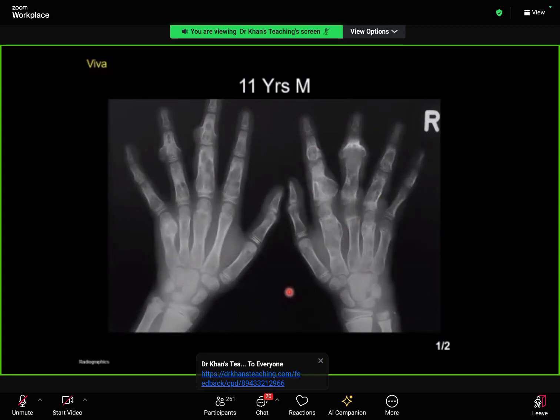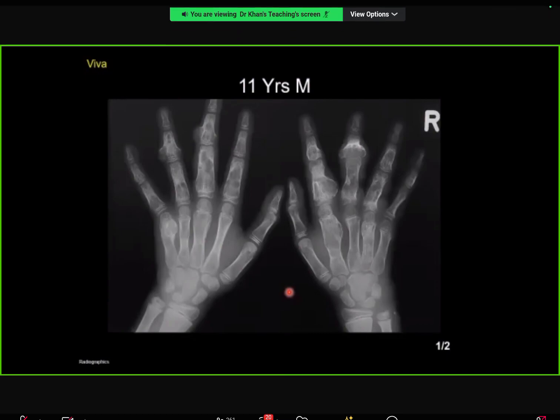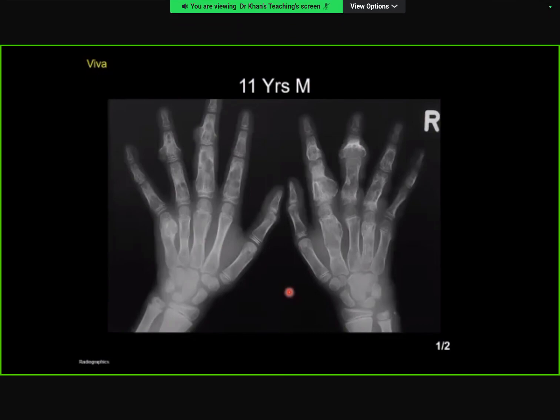There is a multifocal polyostotic disorder with lucent bone lesions that contain chondroid matrix in many of the metacarpals and phalanges. These appear to be multiple enchondromata, and I suspect that the patient has an underlying condition such as Ollier's or Maffucci syndrome.